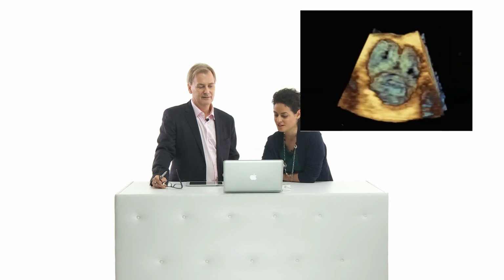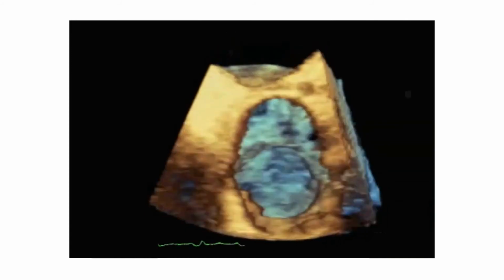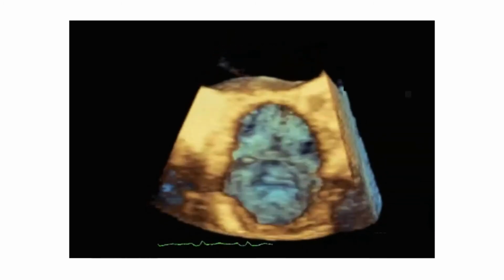I would like to show a 3D image of the aortic valve, which actually really resembles the aortic valves we saw already in the movies. So actually, I think this is really amazing what echo can give us in advanced course. Yeah, I think it's just fascinating what this technique is able to do. Of course, this is something that you will maybe learn in the future courses that you might visit.